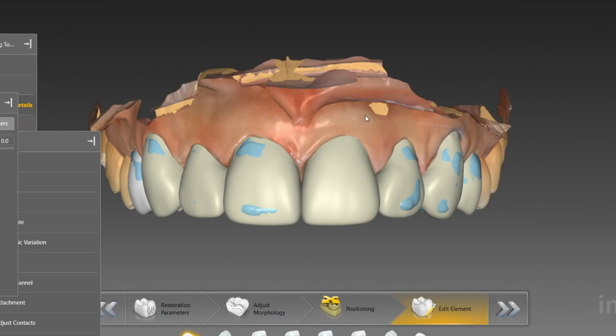And once we've got that, the idea is to pretty much draw a line around each individual tooth on the wax up and hope that the design translates over onto the preps in a nice way so that it's pretty much done for you. So the wax up does the designing for you. That, in an ideal world, sounds magnificent, but we don't live in an ideal world, and quite frankly, the software is not capable of doing that as of right now.